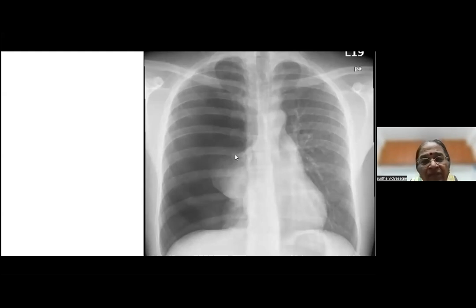Can you make out? When the lung collapses, it goes posterior medially, okay, towards the hilum, and it forms one thing like that. Sometimes this lung will collapse in 2, 3 round things also, okay, because it's not collapsing as one. In this patient, you got a huge pneumothorax. It's a really big one.